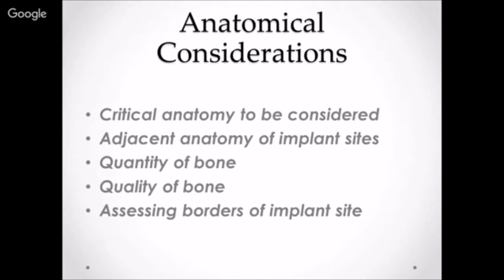Now, this can be physically measured. It is important to assess this because this directly affects how you do your surgical guides, or if you're not using surgical guides, how you pick your implants, and a whole series of other things. The measuring tools are usually programmed and designed for this purpose.